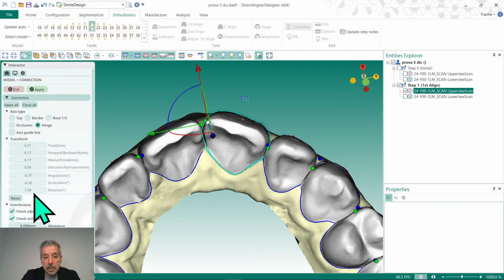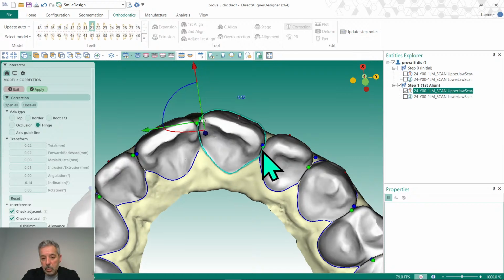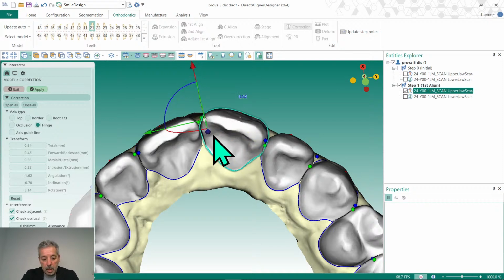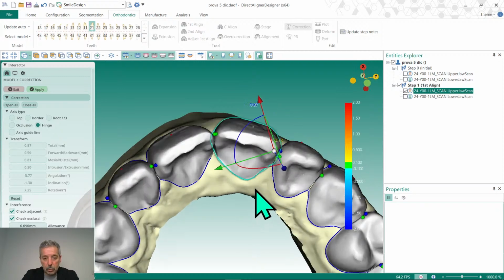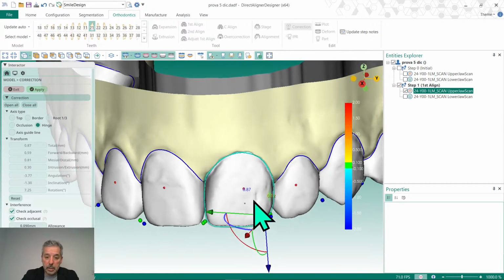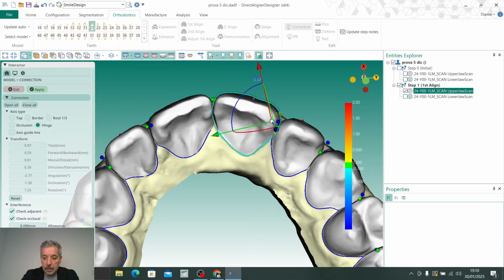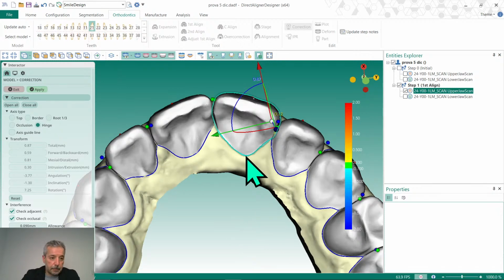This is interesting when you have a good relationship with the neighbor tooth, like on distal or on mesial, and you decide to fix one point and move just the other point, like fix the mesial, like this one, and open, or maybe change and move this one, like two different types of movement. This is so interesting for a rotation movement, and that's it. Okay, basically, right now, reset everything.